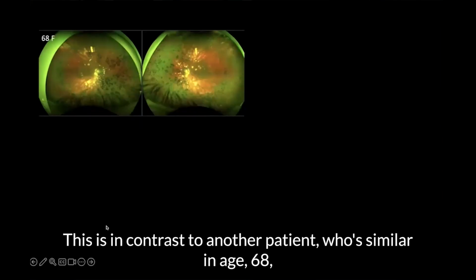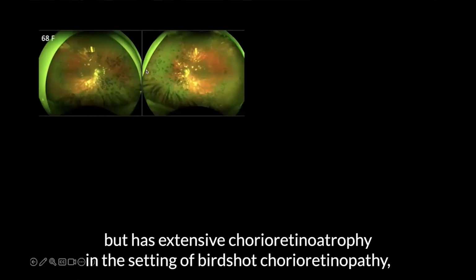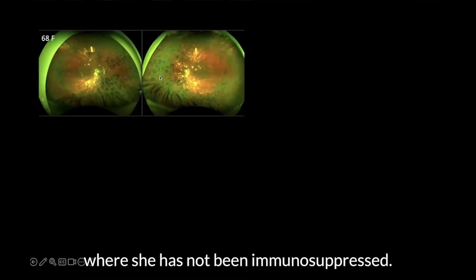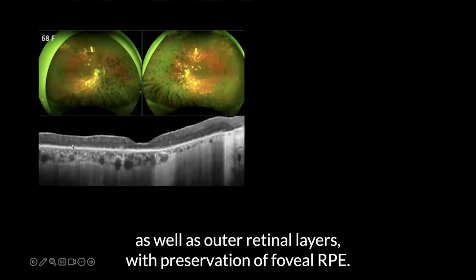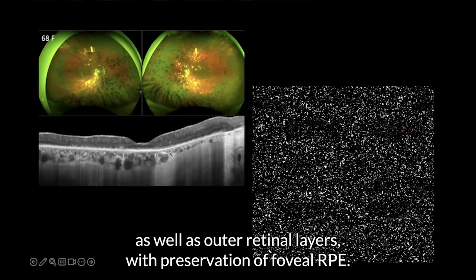This is in contrast to another patient who's similar age, 68, but has extensive chorioretinal atrophy in the setting of birdshot chorioretinopathy, where she has not been immunosuppressed. And you can see that there's extensive loss of inner retinal layer as well as outer retinal layers with preservation of foveal RPE.